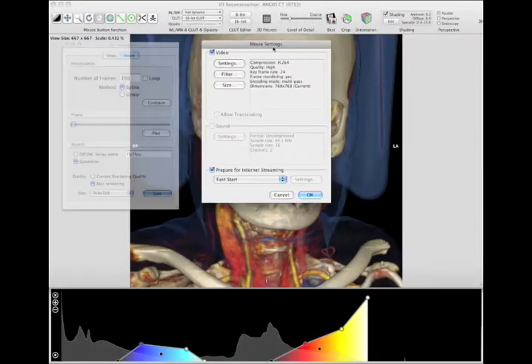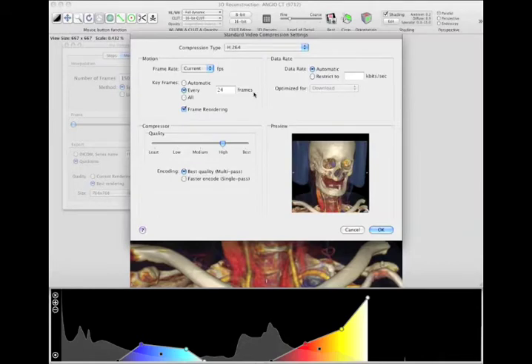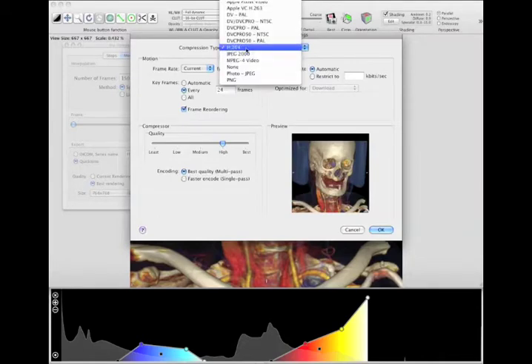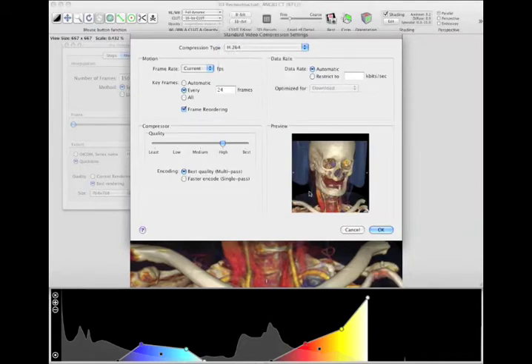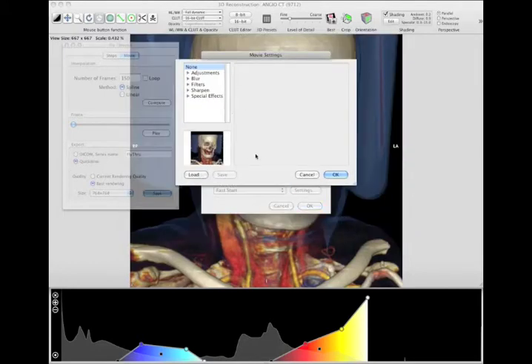So once your movie finishes rendering, you will see something like this. And these are settings for changing the compression. I don't change these. I leave it at H.264. You might check it just to make sure and leave it at high. If you needed to send something to someone online, which you probably won't do, you could change it here. I don't even know what these do. I wouldn't do any of those.